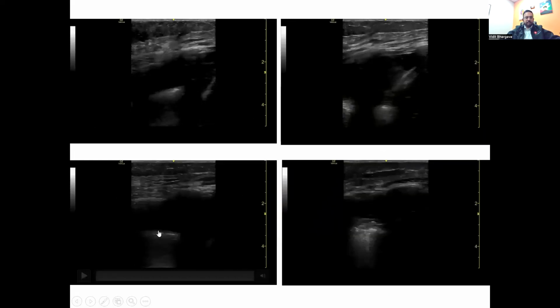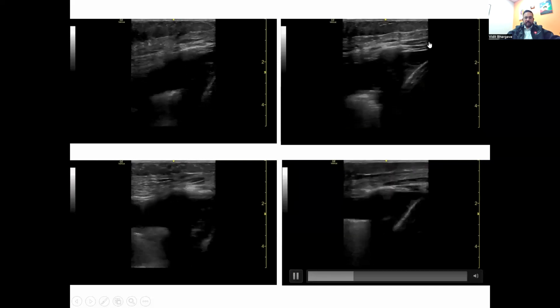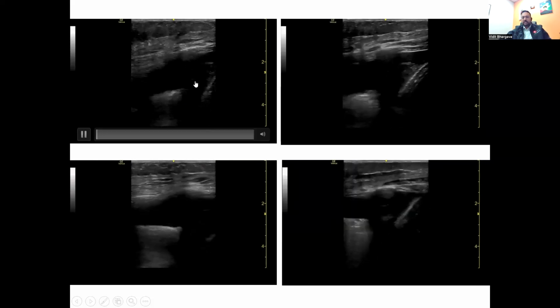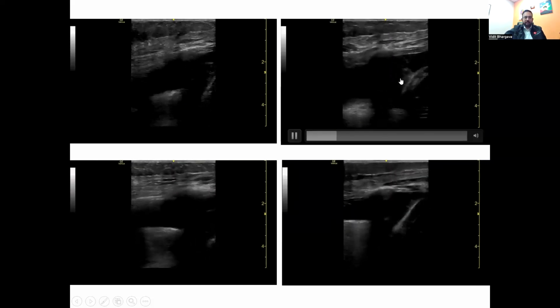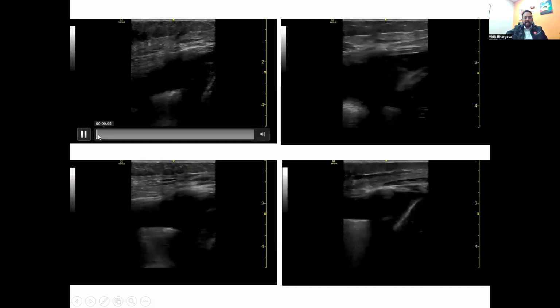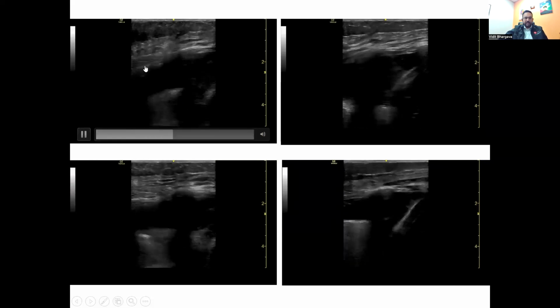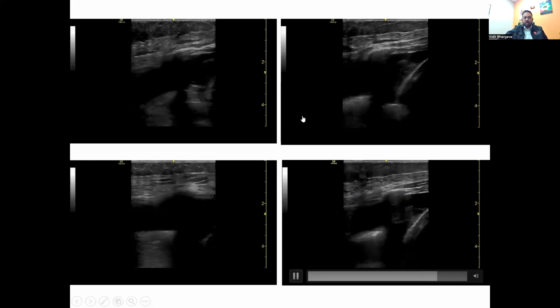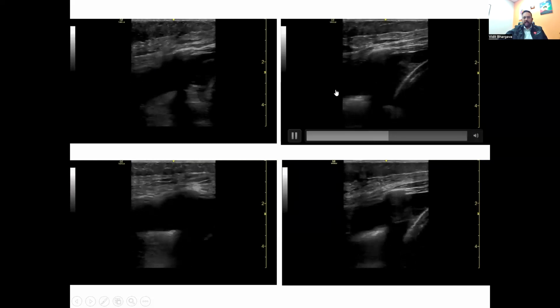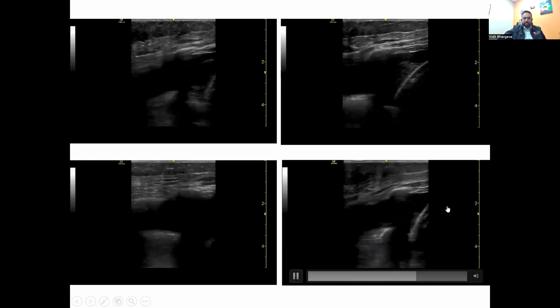And then moving on to the left side, the images look a little bit different in quality because the preset has been switched from lung preset to abdominal preset. So these look a little bit more smooth and less grainy than our lung ultrasound preset images. But nonetheless, in almost all zones here, you can see this anechoic fluid collection, which is consistent with having pleural effusion.